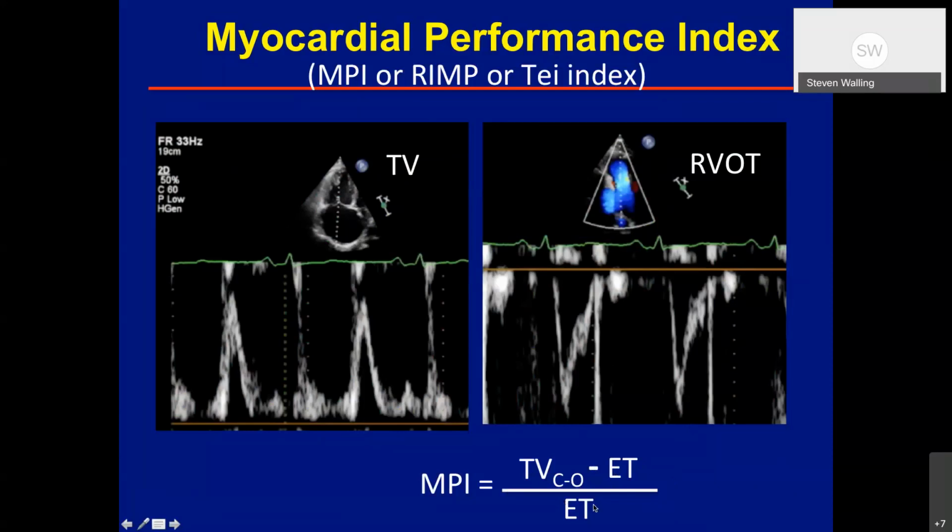So that's actually interesting. You look at here, I draw the line. If you see the EKG, this is the QRS, and you draw a line from tricuspid valve closure. So what happens in this cardiac cycle? Immediately there is going to be an isovolumic contraction time. And then it comes to this side, where when you put it on the pulmonic valve and the RVOT, you can see the ejection of that flow. So that is the real systolic ejection period of time.